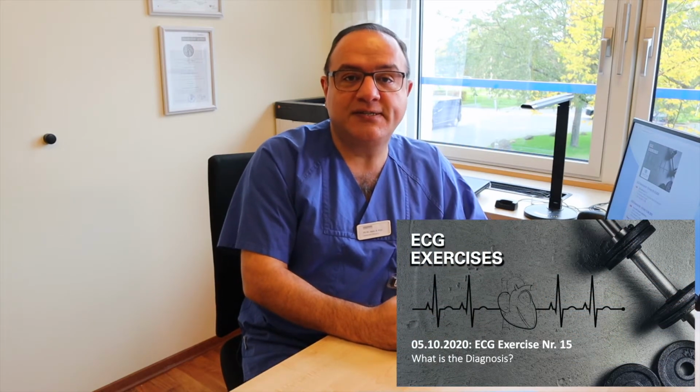In this video, I will discuss the ECG findings in the ECG exercise number 15.